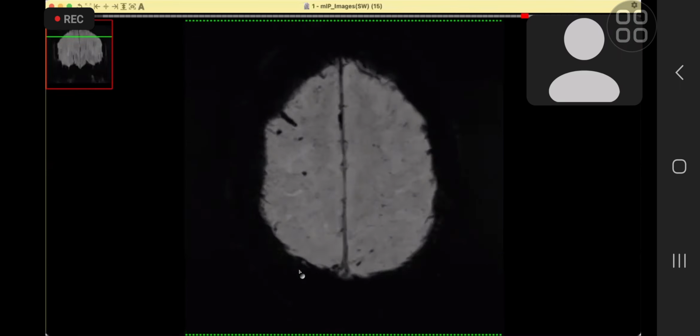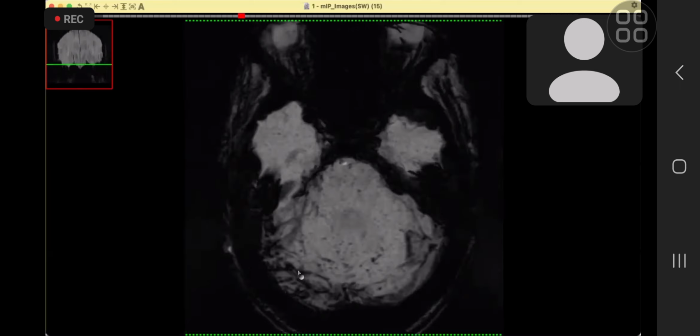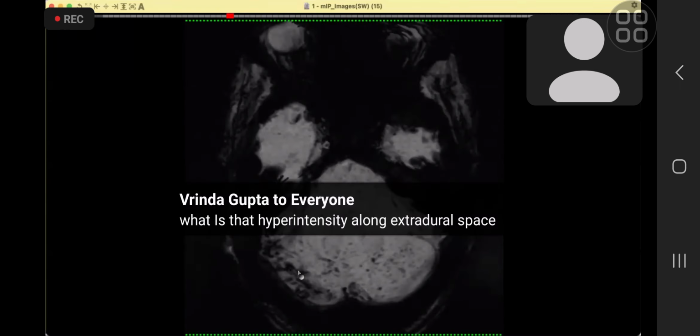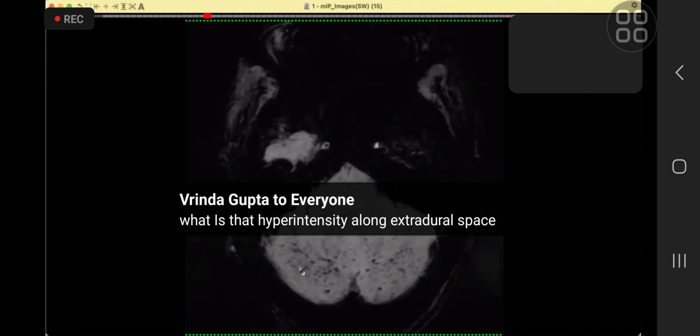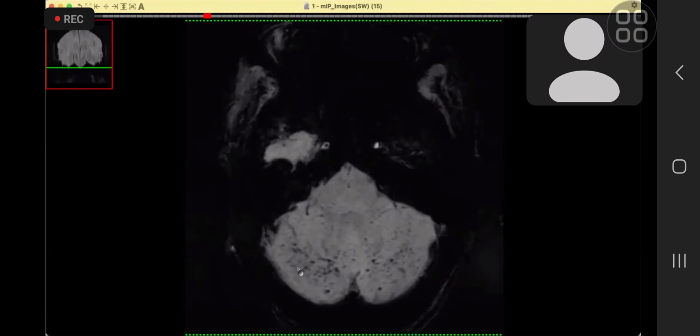In this particular scenario, it could be related to early ischemic changes, but they are not seen. Hint: the patient had multiple fractures. Okay, so these could be multifocal fat embolic ischemic changes. Okay, then, thank you.